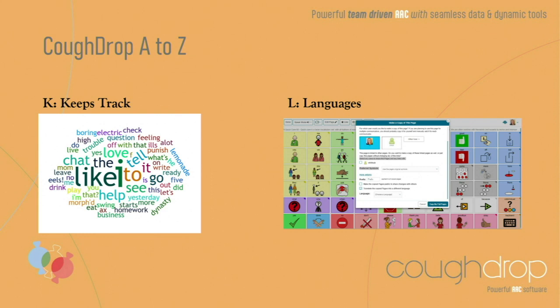Any of those, we have it integrated in. You can copy the page set and then it will translate over into whatever language you're looking for. Also, if you have anybody in Portuguese, our core word is available in Portuguese with the correct syntax. That's a whole other hot topic, a whole other day, not a 20-minute presentation, but just know that that's an option if you have someone that you're working with in Portuguese as well.